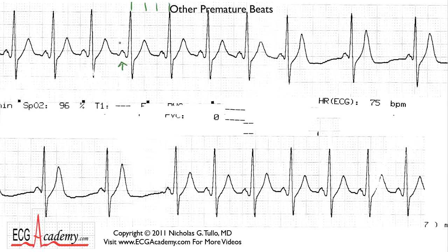There's a nice P wave with a normal PR interval of about 140 milliseconds. And so you have sinus rhythm at 100 beats per minute. In fact, I think it's right on the border of 100. Each of these QRS complexes seems to land in the same position with respect to the heavy line.